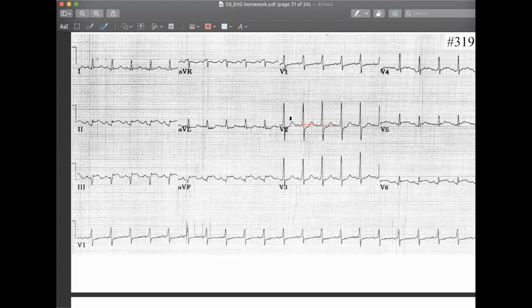But you would need to have the high R wave and the depressed ST. Yes, and the R is very big. If you look at the RS ratio, the R should be bigger between V3 and V4. Okay. Now wait a little bit, please.